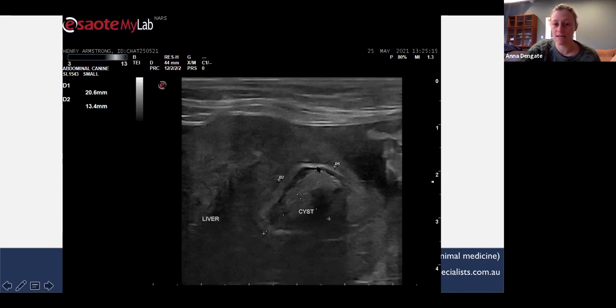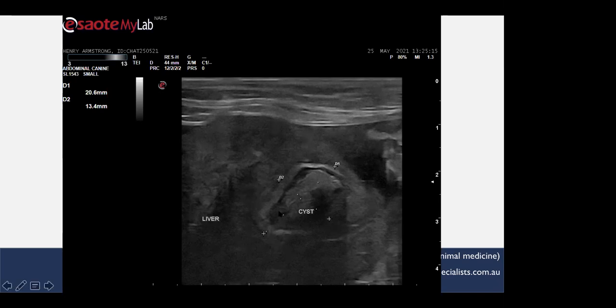So this bright center and then this very dark surround. That's really suggestive of bleeding, particularly nodules that have that target appearance, which is quite consistent with a hemangiosarcoma. Not pathognomonic for a hemangiosarcoma, but quite consistent with a tumour that is prone to bleeding. It's a very good description, Jill.